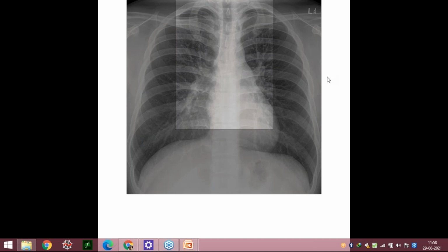Once you go through the pathologies of mitral stenosis and mitral regurgitation, you will come to know why we are talking about why in MR it may be a possibility, but in a classical MS, in a patient who has had MS for, let's say, the last 3-4 years or 5 years, will definitely have cephalization in the upper zone. So where was I? I was telling you about the PA view and the AP view. So in PA view, we will have the scapula which is retracted.